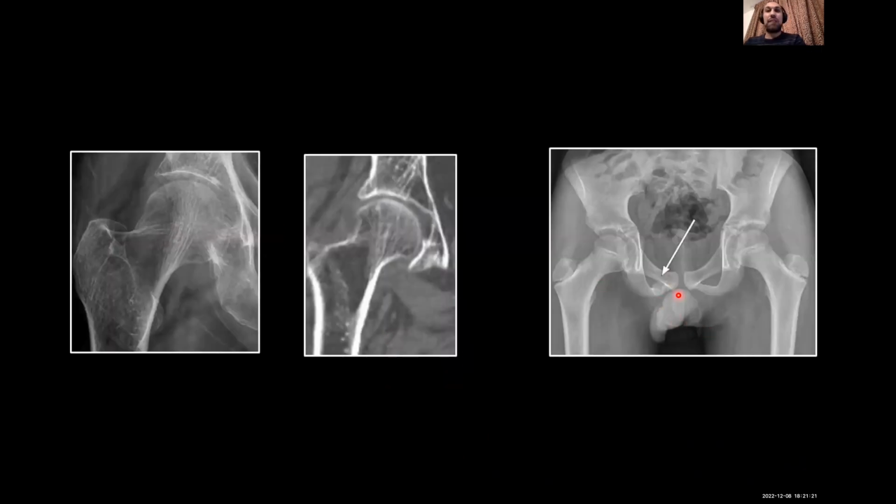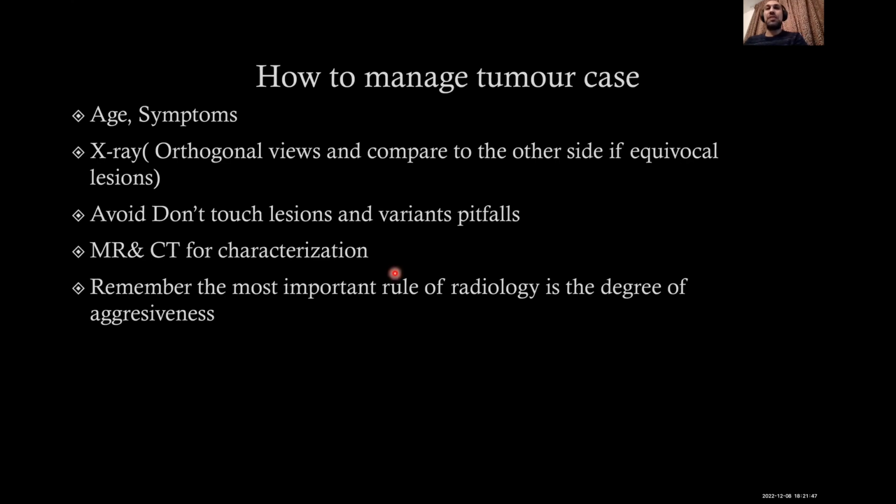Okay, this is not a fracture, just because this is related to the... I'm sorry. Okay, I will say it, but I will finish now. This is not a fracture. This is synchondrosis. Okay. This is not a fracture. As mentioned, this is the area of trabeculation.